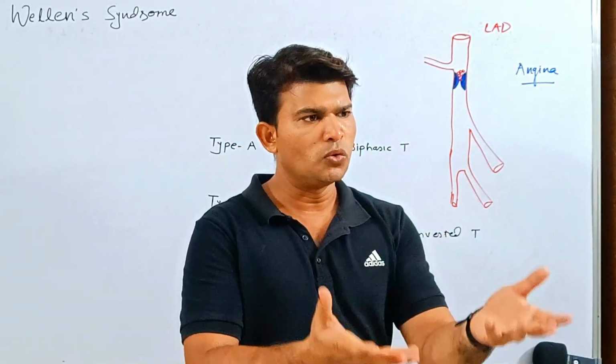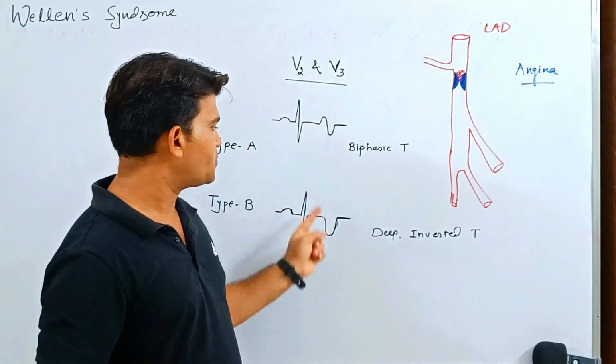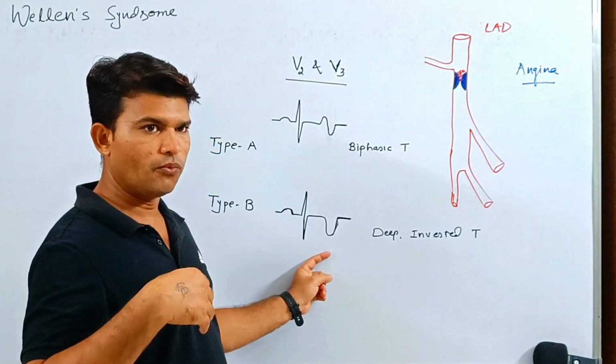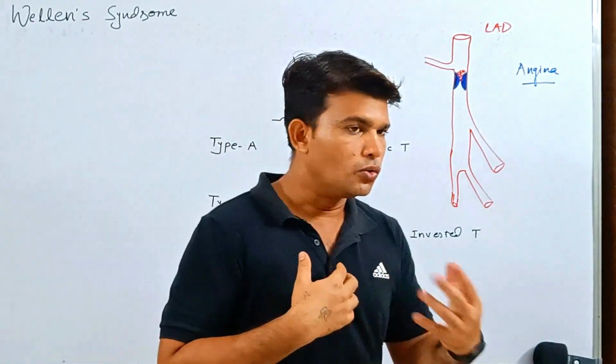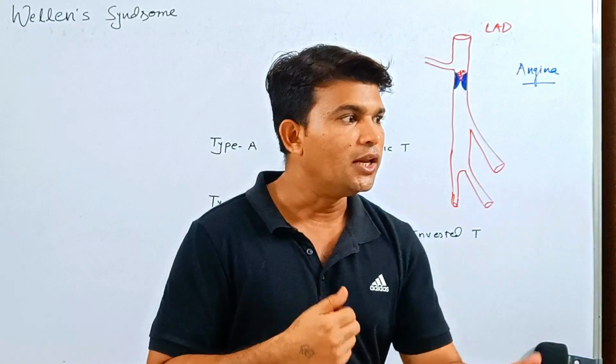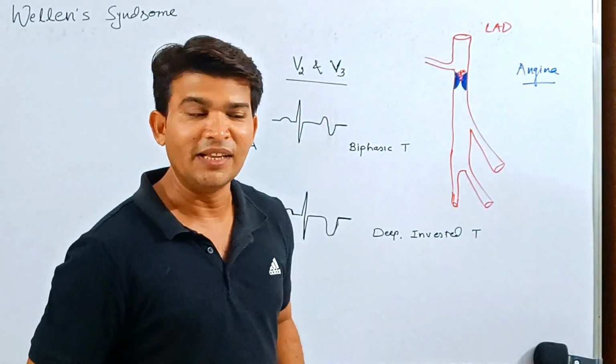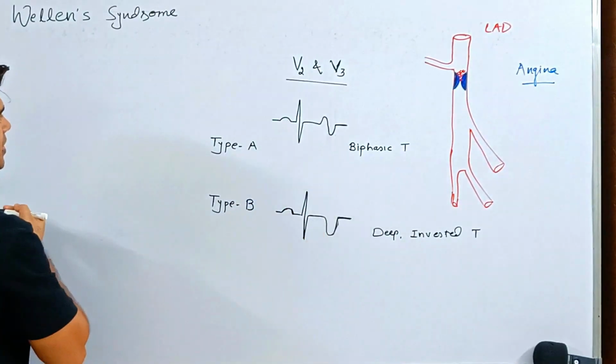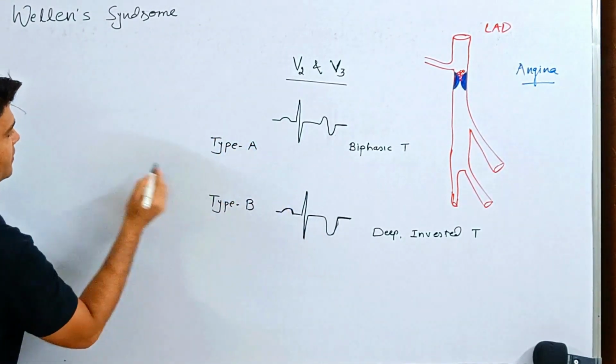Two days before, I came to you. You took an ECG, and I had this pattern. And after 2 days, I am again coming to you with signs and symptoms, and you do my ECG, and this time the ECG is perfectly normal. You are having this pattern. Compare this pattern with this pattern.